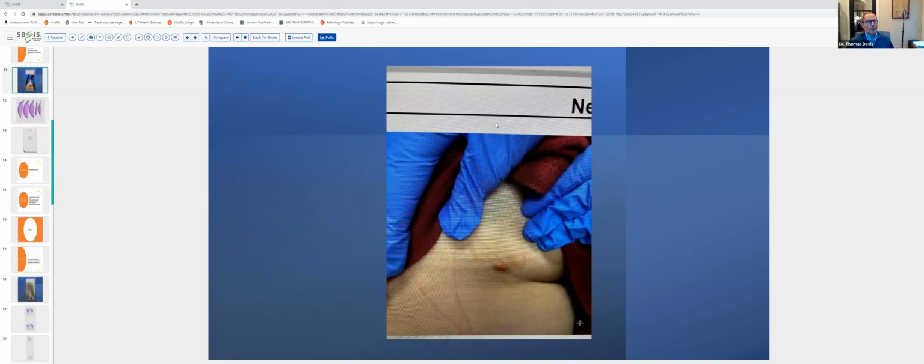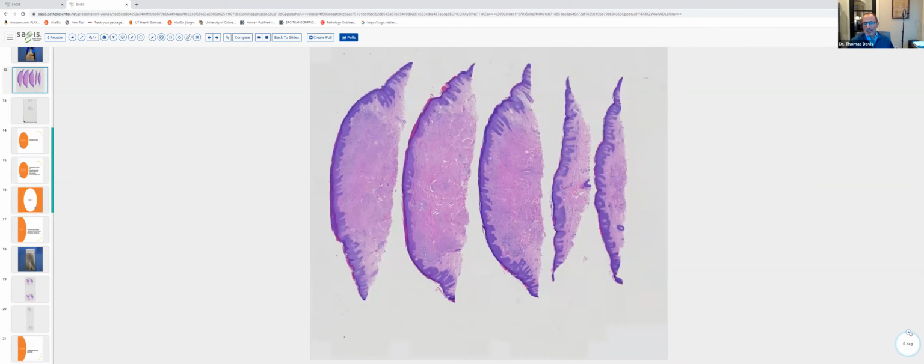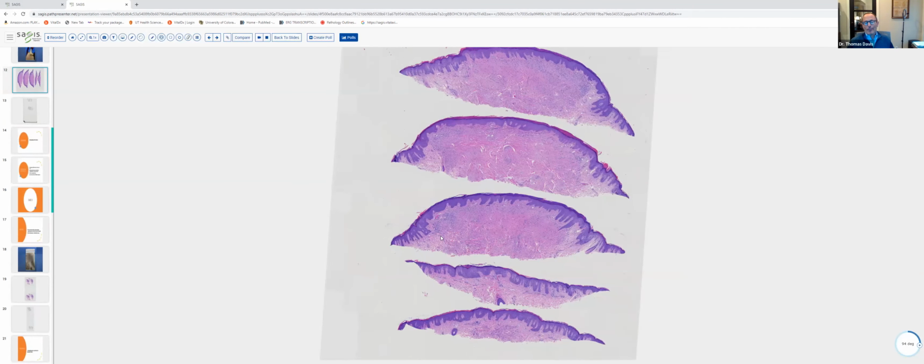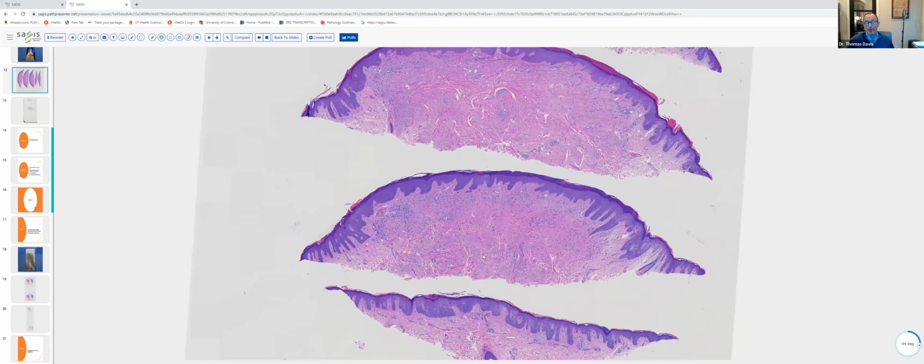And in this clinical photograph, we can see this reddish-brown papule, well circumscribed on the buttock, not particularly large. A bread-loaf shape biopsy reveals a dome-shaped papule with a dermal infiltrate. The epidermis is mildly hyperplastic, and even at scan, you can see why this lesion was firm to palpation or somewhat indurated. The cellular infiltrate within the dermis is embedded within a very sclerotic stroma. Notice how thick and pink and sclerotic these collagen bundles are.